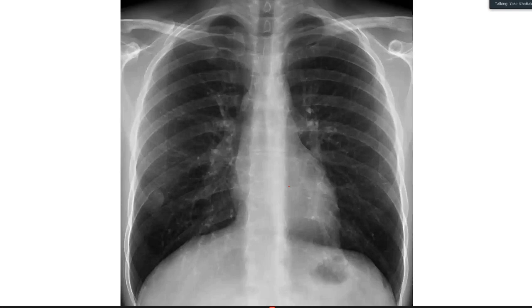Hold on. Right, I'll stop you there because you will go away from your main finding now. Stick to your finding and tell me what's your differential diagnosis, or what do you think this is? Yes, sir. Sorry. So I said, just stick to your main finding that you explained, and mention a differential diagnosis or a diagnosis based on your findings. Sir, that opacity, the well-rounded one which I mentioned. Yes. Sir, I will say it is a solitary pulmonary nodule with well-defined margins. And okay. So I'll stop you here.